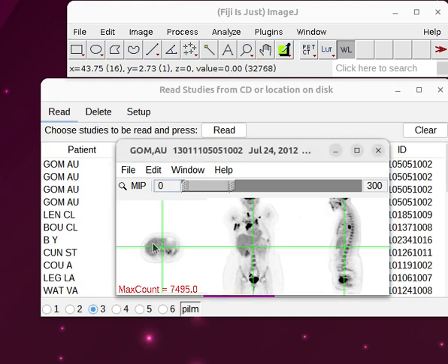And if I want to look at this thing, I can hold down the left button and go left or right or up or down. You can see how it's changing this bar. You can change the bar by yourself. Do whatever you like. I find it easier just to click on the study and move left, right, up, down.